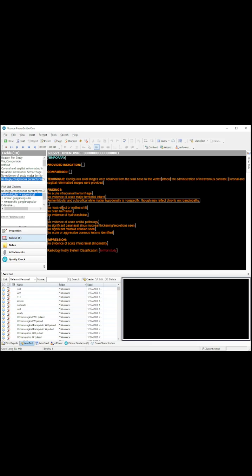So that's one way to leverage this functionality to improve your efficiency and, truthfully, also minimize the chance of error that arises from the imperfection that voice to text can sometimes introduce inadvertently.